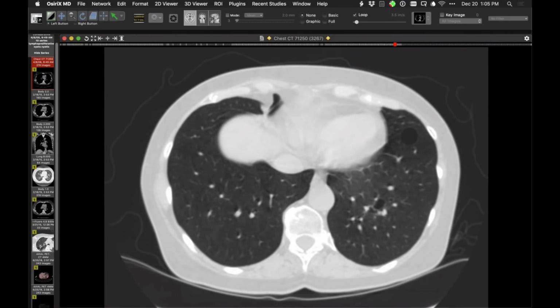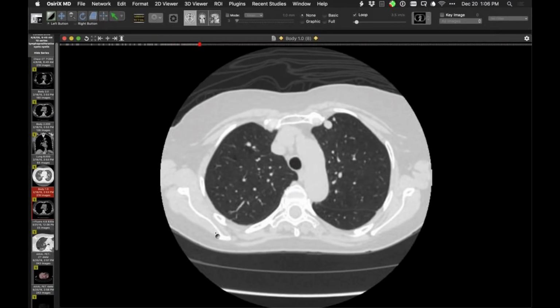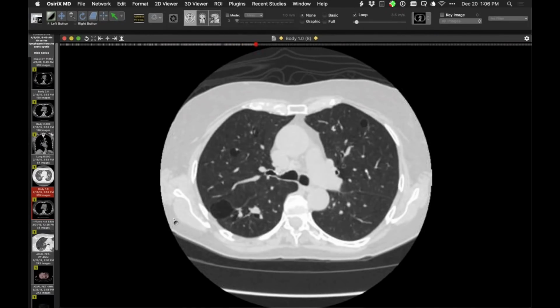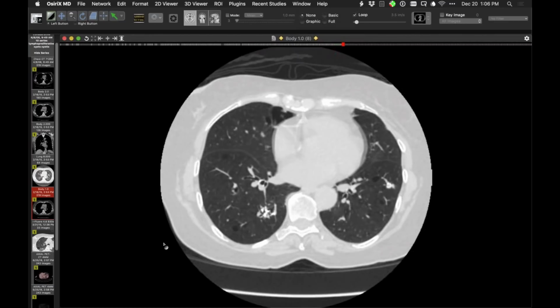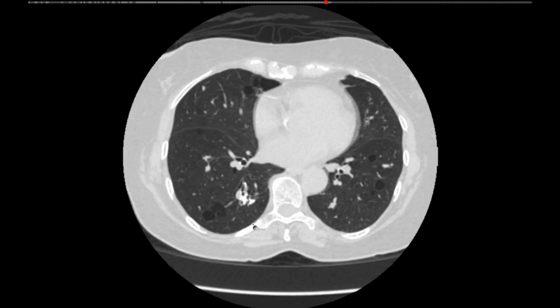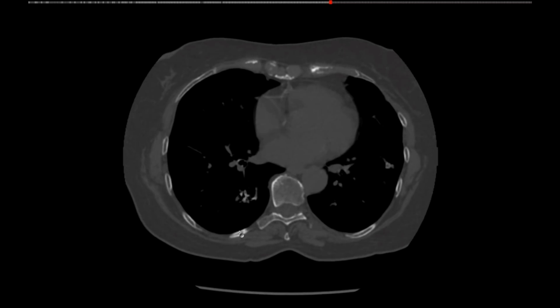So this was biopsied. Let me show you a couple of images from an exam that has thin cuts, just to give you another feel for what these look like. So they are increasing in size, and the nodules are getting a little bigger. And some, for example, down here in the right lower lobe are also calcified or ossified in part, as you can see there. This one too.